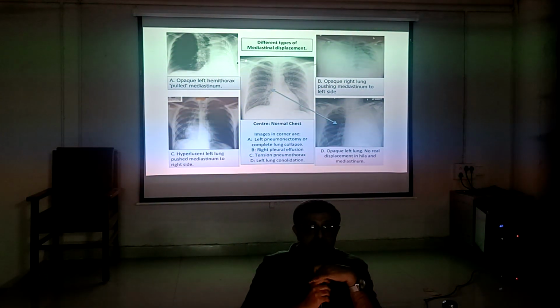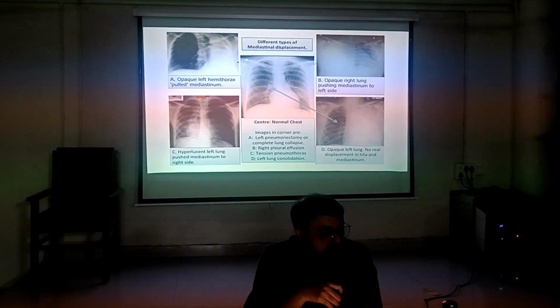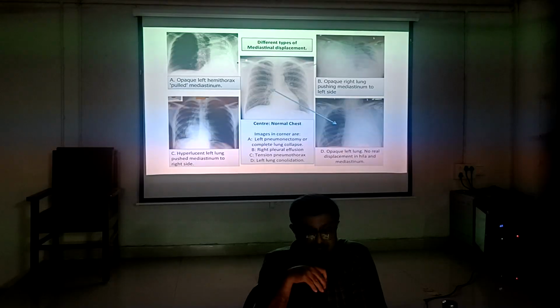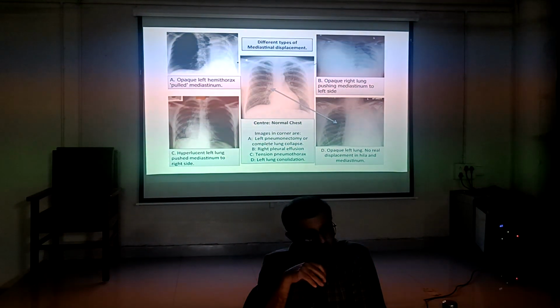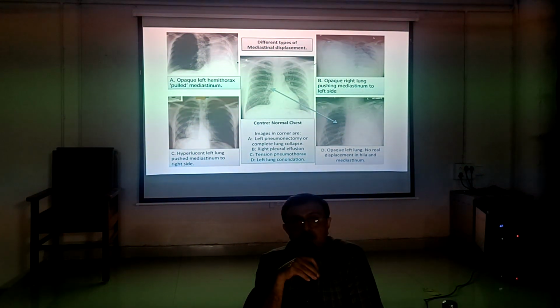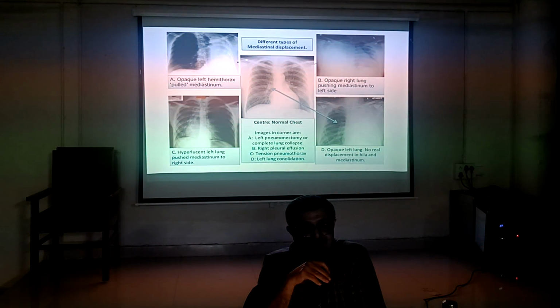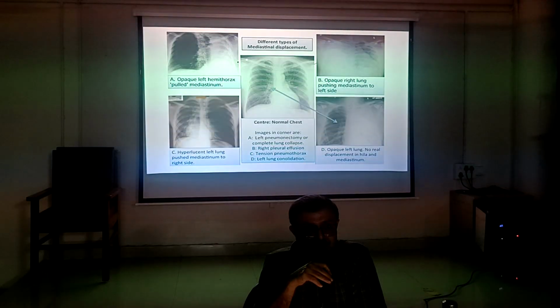This is hydrothorax or pleural effusion. Okay. Hemi-opaque lung, but the mediastinum is not pushed or pulled. Then it is consolidation. Then it is pneumonia.